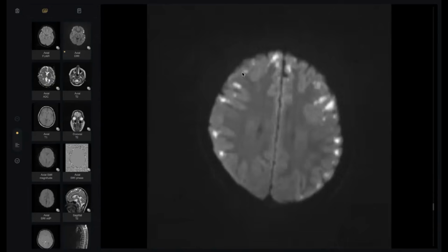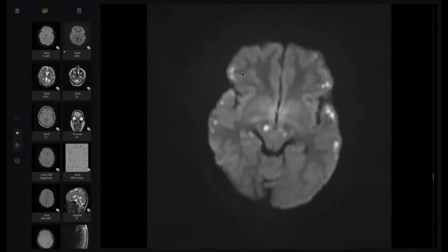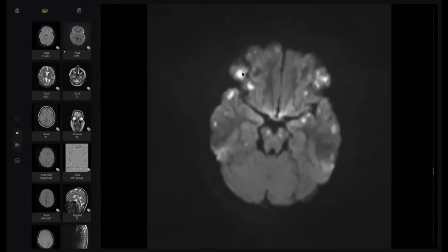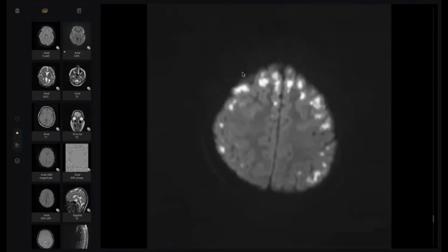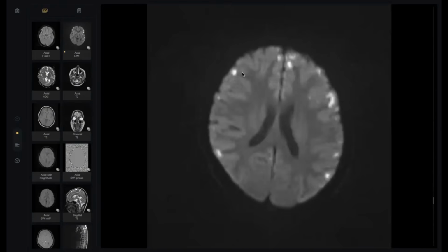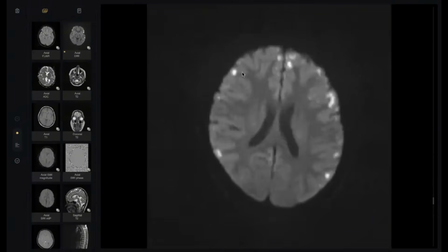What is the cause of infarction here? The examiner is helping you, so don't shift from the last result. You suggested showering emboli, and the examiner answered that showering emboli are more extensively random. What else?